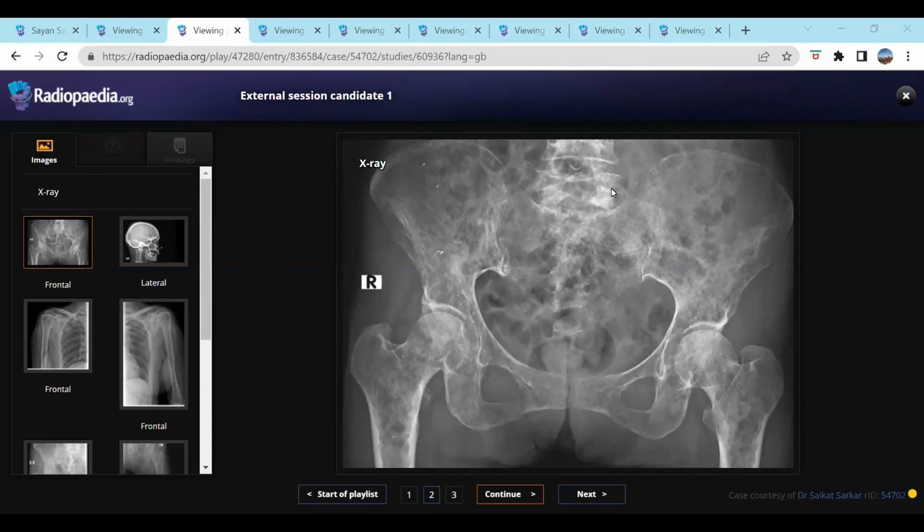However, there is a slight sclerotic line that can be seen along the neck of the left femur, which is suspicious for an impacted fracture of the left femur, and also some degenerative changes noted along the visualized lower spine.